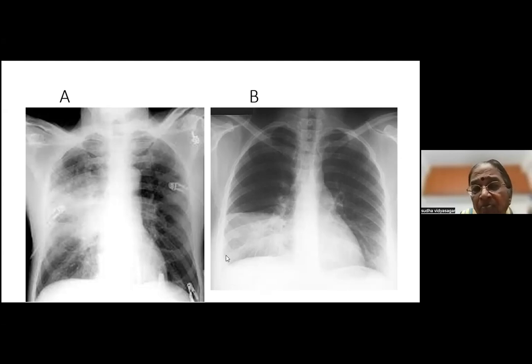There may be a small effusion here. We are not very sure, so we leave that alone, but it's a nice consolidation. Can you make out there's a nice line there? So that's not an effusion, right? Okay, fine. Look at this one.